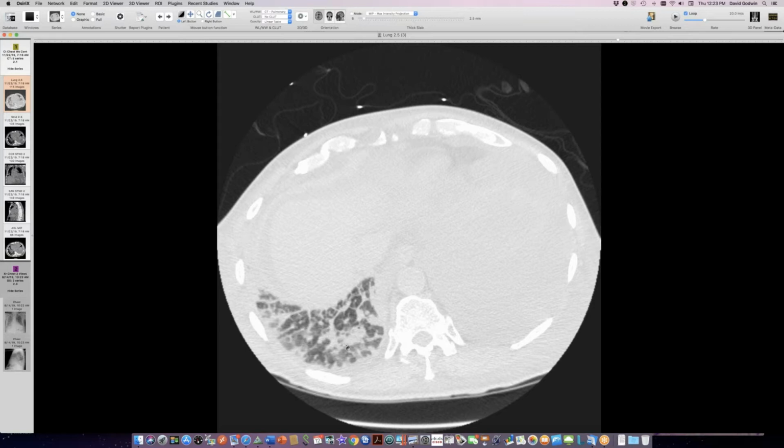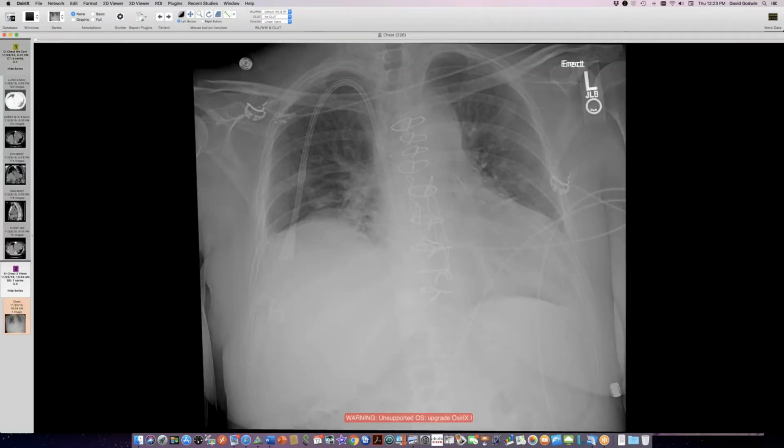Okay, so amyloid, definitely in the lung and probably in the heart too. Okay, and then this is a person who'd had a heart transplant and does have a diaphragm complication of heart transplant. The hemidiaphragm is elevated here. On CT, the crus is thinner than it was pre-op, but it's not completely wiped out the way it would be with paralysis. So I think there's still some phrenic nerve function going on, and the diaphragm hasn't atrophied to the point that it would, but it's been elevated now for several months.